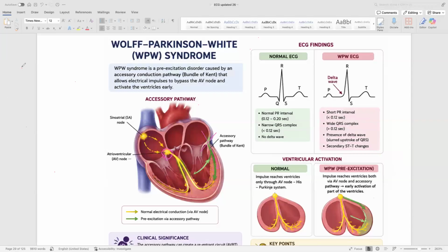There is only one problem here now. If this patient is having atrial fibrillation, the rate may be 220, the rate of contraction, because it's fibrillation, and maybe more. Most of the time, electricity may be going here, right?